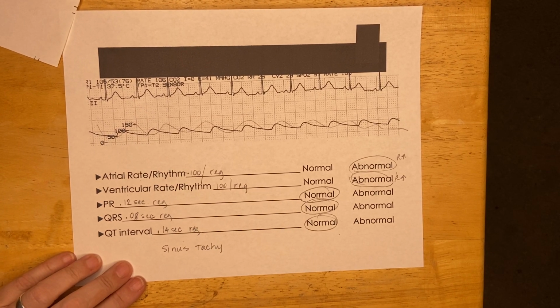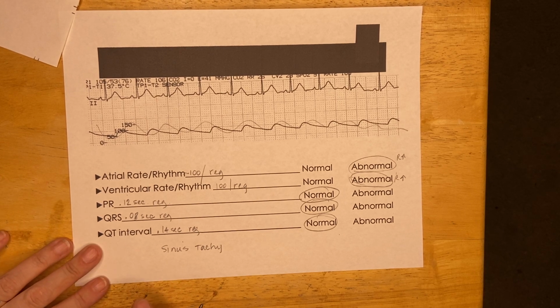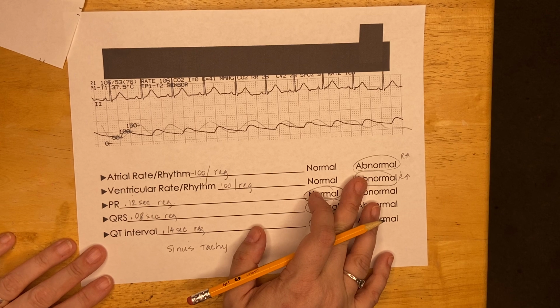The sinus tachycardia doesn't necessarily mean something grave is wrong. It might just mean somebody scared you or you walked up the stairs. And there's lots of reasons why heart rate increases. You have to think about it in context of what's happening with your patient to know whether it's a problem or not a problem. So that is a brief overview of best practices for how to measure EKGs.